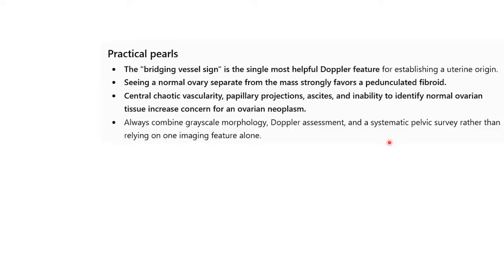This is a masterclass ultrasound lecture where we are going into the depth of ovarian masses, how to differentiate them, so that we don't cause unnecessary panic, unnecessary expenses, or unnecessary complications to the patients.